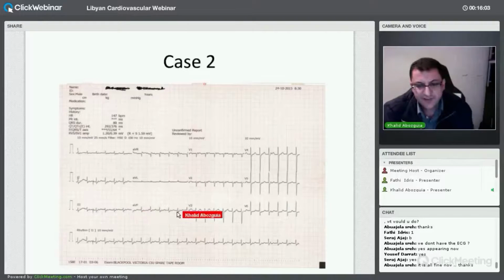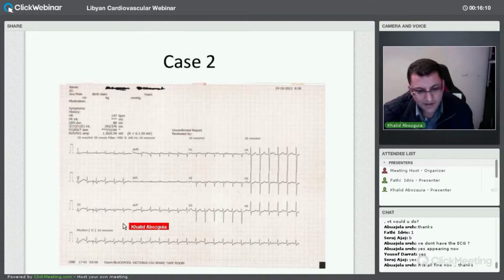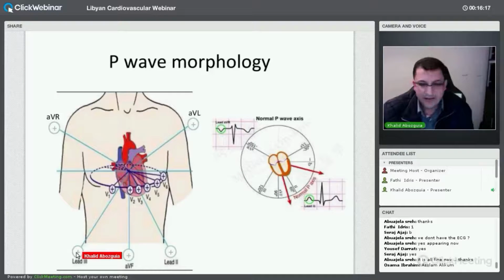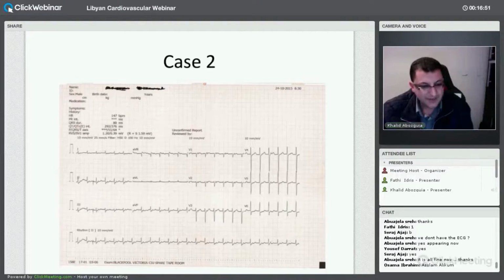So this suggests that our P wave activation is high to low. If our inferior lead is positive, it means our activation is coming from high to low. If it were from low to high, the P wave would be negative. So this makes AVNRT unlikely, because we know for AVNRT, which is the commonest form of SVT, you have activation of the V through the slow pathway, but the A is activated retrogradely through the fast pathway, in this direction, which means your P wave should be negative. However, there is a trick.